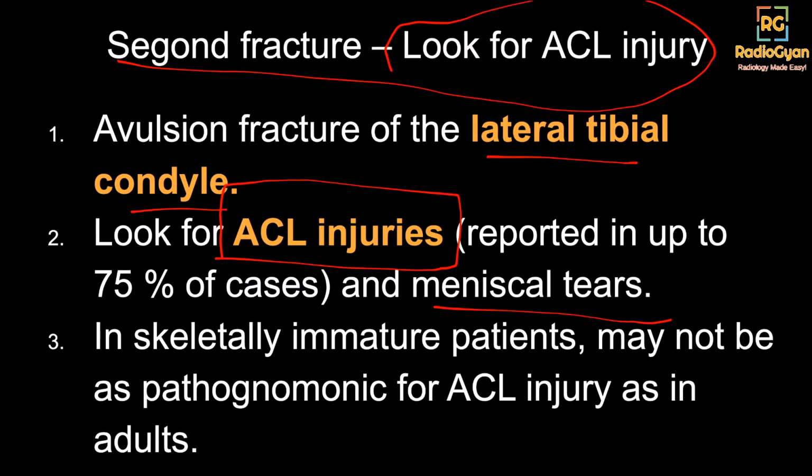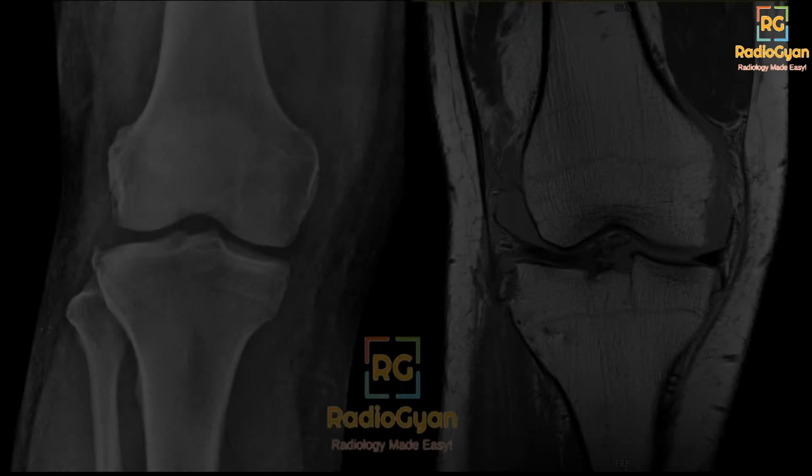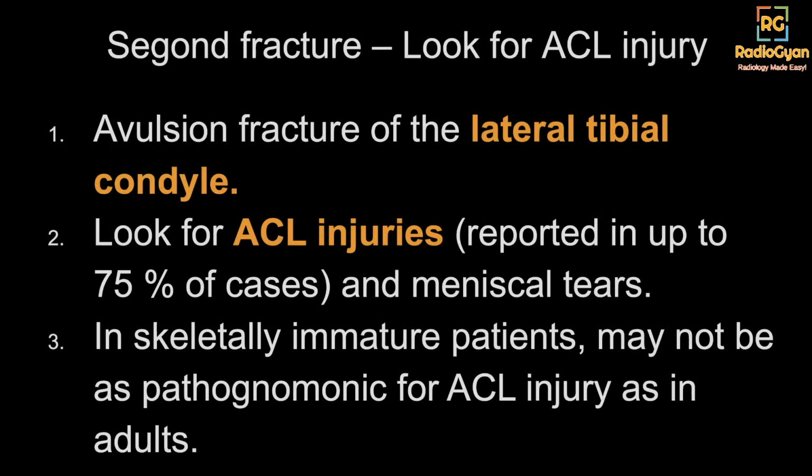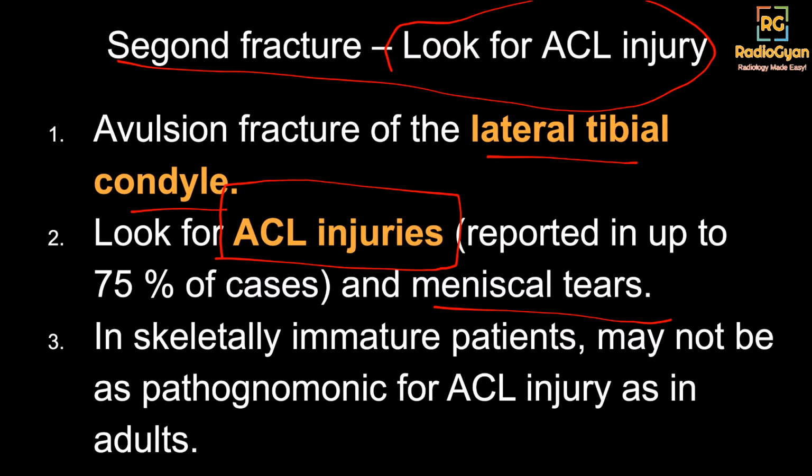So yeah, again Vivek is talking about the medial meniscus. It may be, but again on a single image I would avoid. It can be, but I see what you're trying to say here about the medial meniscus, but it's very difficult on a single image. You can still comment upon it, but if you have one classic diagnosis, I would avoid a second one, especially in this case. But I agree that here it looks a little bit, but not too much, not very convincing. But yeah, so you're right that it's associated with ACL injury and meniscal injuries.